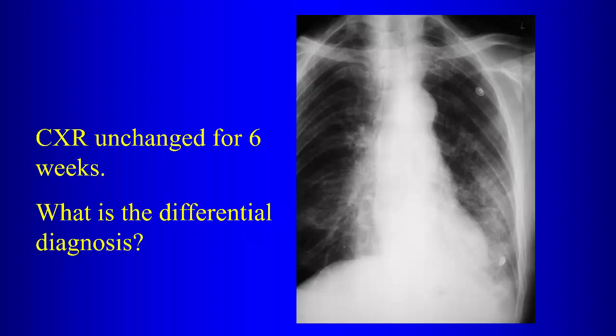Well, you said pneumonia, how are you going to describe the X-ray? What does it show? Airspace opacities. So consolidation, right? So you have a consolidation there. It seems to be in the left lower lobe, okay?